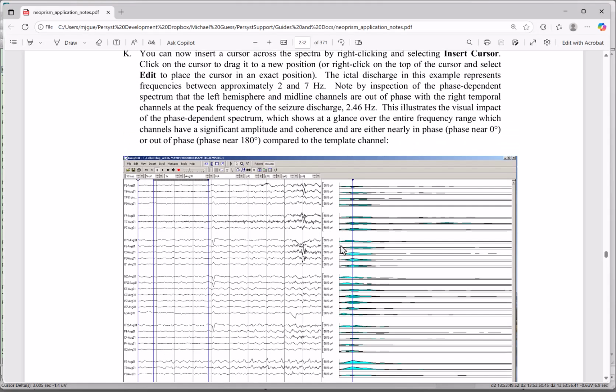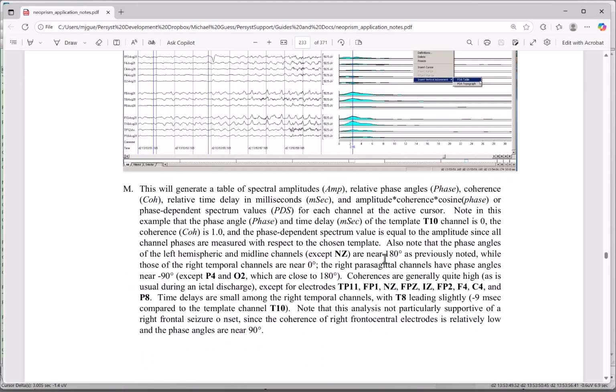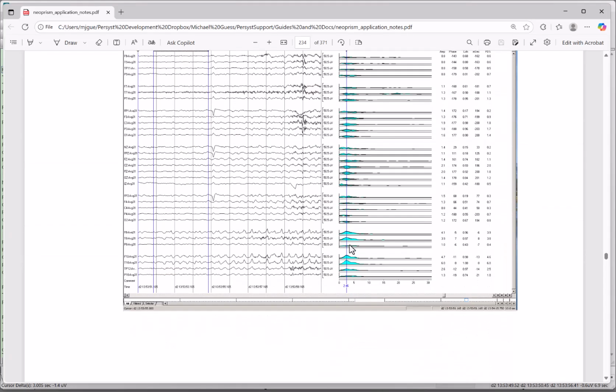And that's why it's handy to have the same recordings that were used, so you can look at those and see, all right, this is what I'm looking at. Let's go ahead and drop a cursor in and show the same table. But again, this goes through the review of what they're looking at. And I think that's kind of a nice piece that they've added to that document.